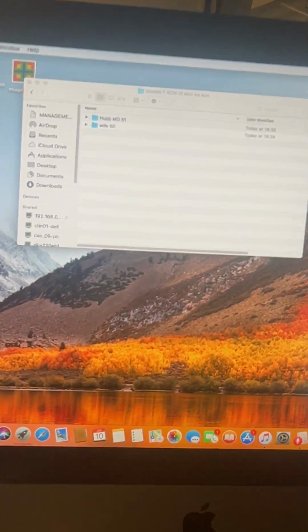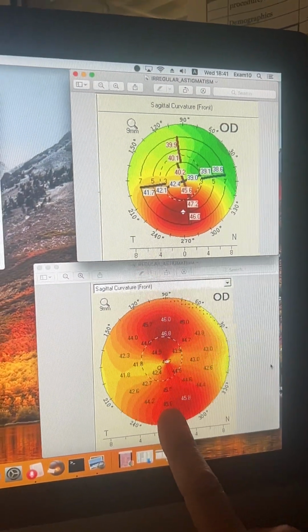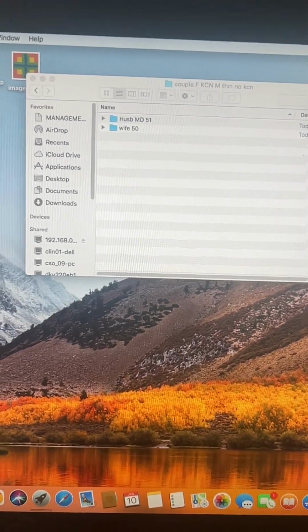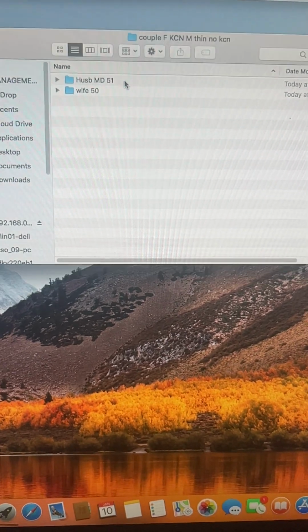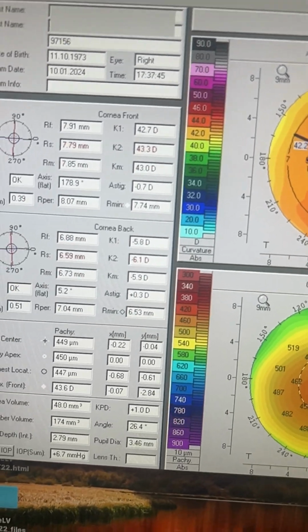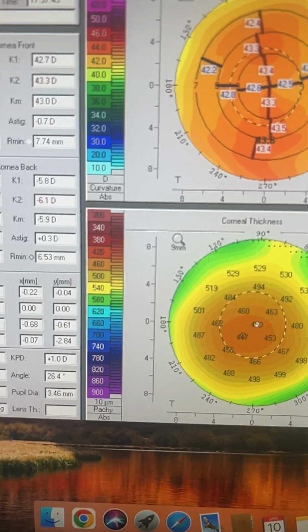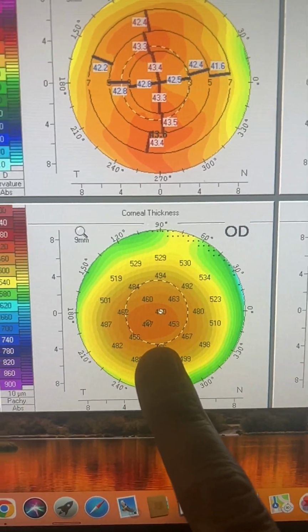And of course, our favorite subject: normal cornea, normal high astigmatism, or keratoconus. Let's see a couple here that we saw today. Quite impressive. Both of them hyperopic. Let's go first see the gentleman who happens to be a physician. He's 51 years old, and this is the cornea. Now, thinnest part of the cornea, 447.